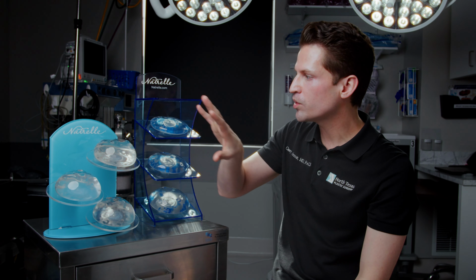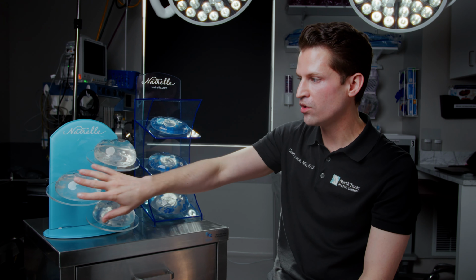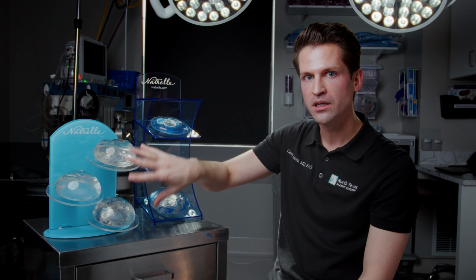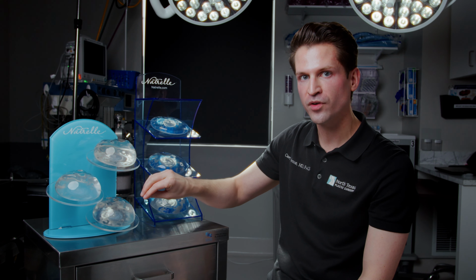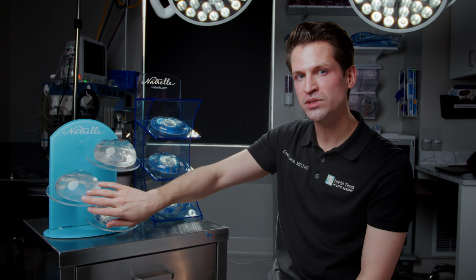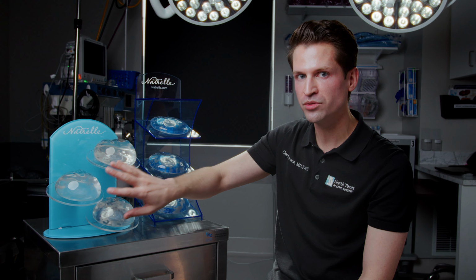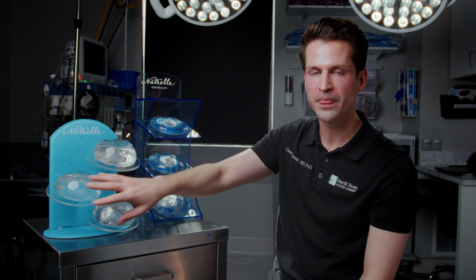And so that's profile. We have cohesivity. So these are all the same size here, but each one is a different firmness. The majority, 70 to 80% of people pick the soft touch implant, which again, I'm getting a little too nuanced, but the middle one, because it'll give some nice roundness at the top, but isn't that super firm one that can get a little augmented looking for folks.